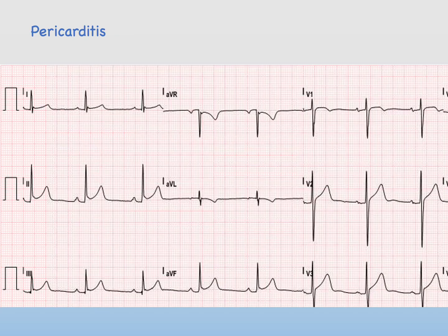Some features are important in their absence when we're looking at making a diagnosis of pericarditis, especially there shouldn't typically be Q waves in pericarditis. Reciprocal changes are another important negative. If present, they should be confined to AVR and V1.